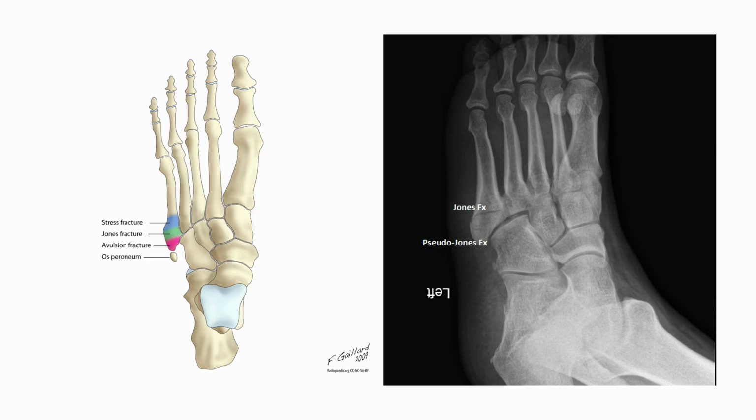This is an interesting image which contains the classical avulsion fractures. We will see, peroneus brevis attaches to the base of the fifth metatarsal, and if there is a simple avulsion, it's called pseudo-Jones. If it is happening at the level of the syndesmosis, it's called a Jones fracture, and anything above is the shaft fracture. At between 10 and 12 years of age, patients may come and you will see an os peroneum. That's not a fracture.